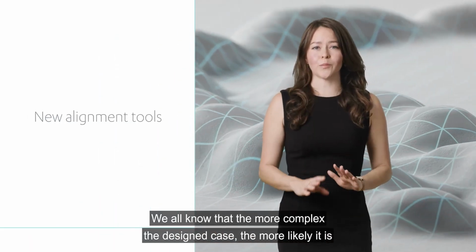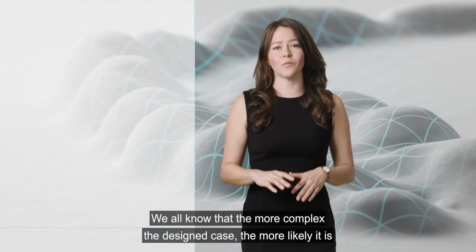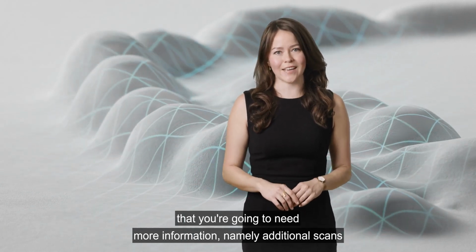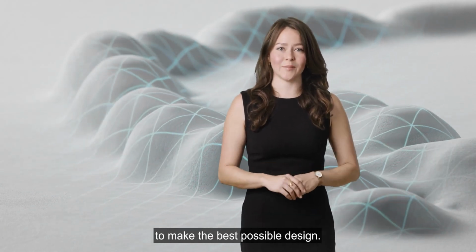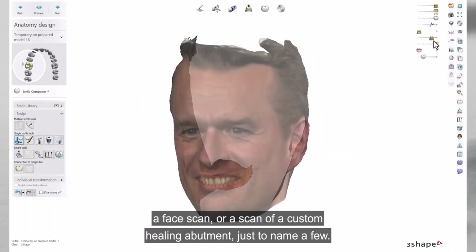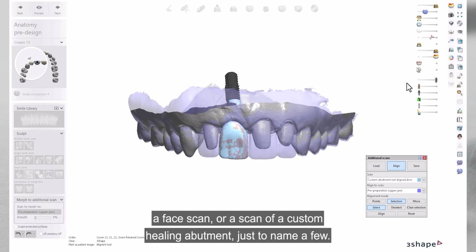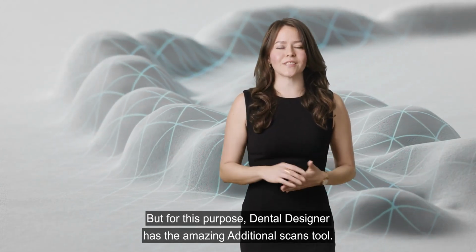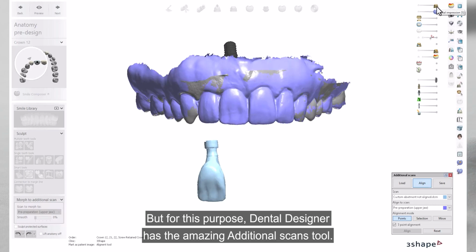We all know that the more complex the designed case, the more likely it is that you're going to need more information, namely additional scans, to make the best possible design. It can, for example, be a pre-preparation or a mock-up scan, a face scan, or a scan of a custom healing abutment, just to name a few. But for this purpose, Dental Designer has the amazing additional scans tool.